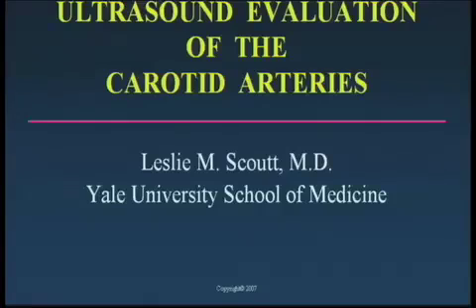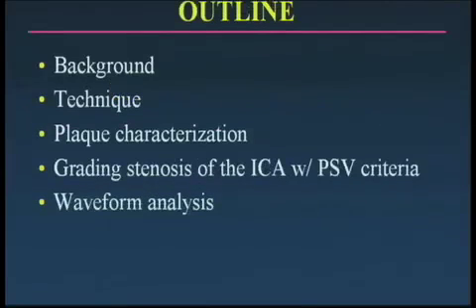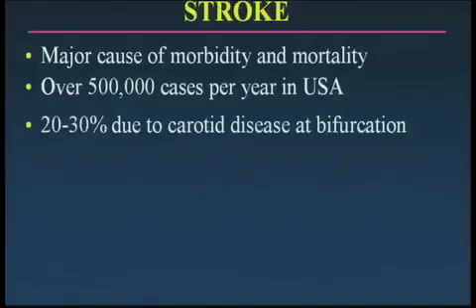So this next segment will be a presentation of ultrasound evaluation of the carotid arteries. We're going to talk a little bit about the background, technique, and then focus on characterization of plaque, grading of stenosis of the internal carotid artery with peak systolic velocity criteria, and then finally end up with evaluation of the carotid artery waveform.